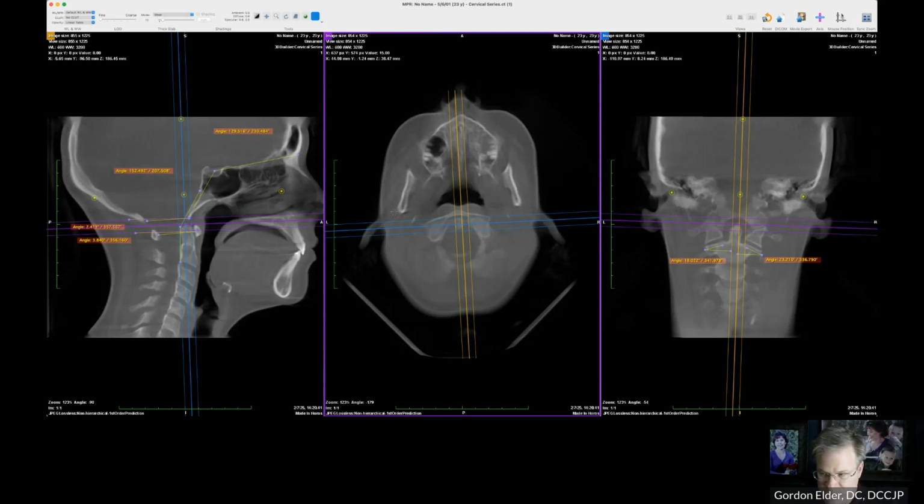Right, so I've got all those measurements. I've written them down. Typically, I will look at tilt and kink, the orthogonal concepts, and use that to help me decide which side to adjust a patient on, since most of our adjustments we can adjust from either side. Dr. Blair found that the primary motion of the cervical joints, the facets, and the AO joint is anterior and posterior, not lateral. So laterality is secondary to anteriority and posteriority, and if it's gone forward, you can push it back from either side. You just use slightly different leverage points.